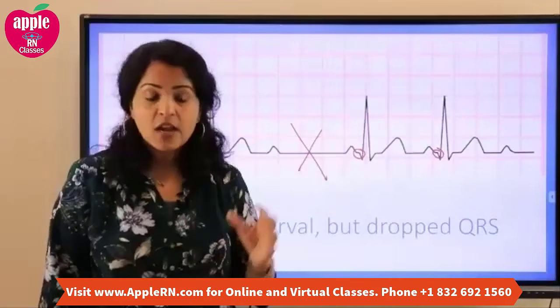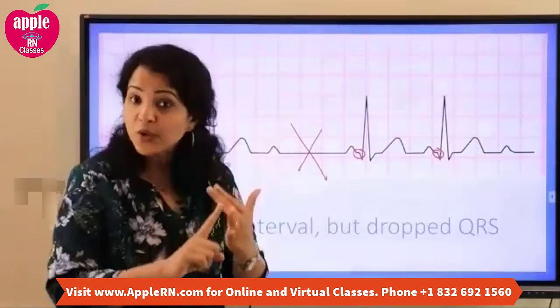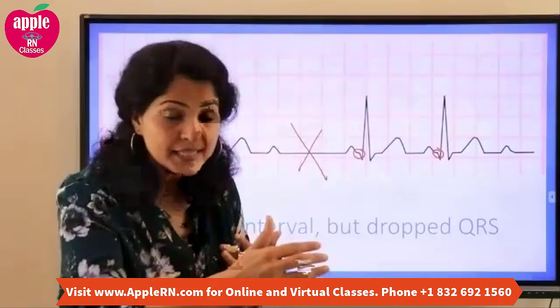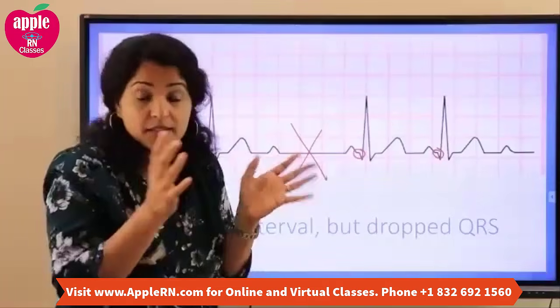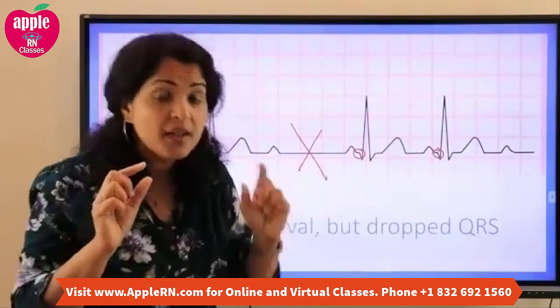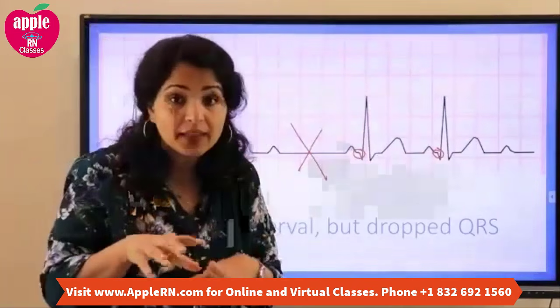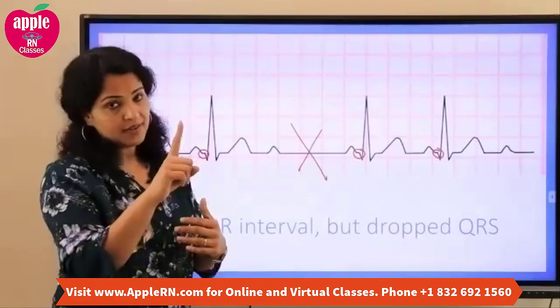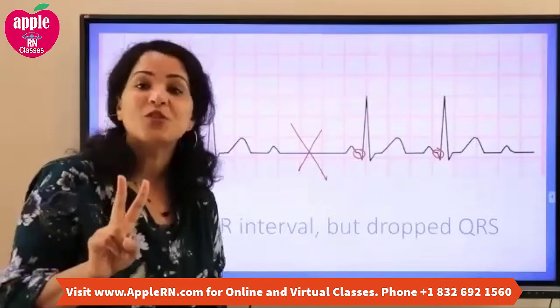How do we identify? Always look at the ECG and see if there is a P and QRS for each beat. If there is a P and QRS for each beat, then that is good. Then look at the PR interval. If there is a P and QRS, but the PR interval is longer, that is first degree. Now, if there is QRS dropping, then it's second degree. In second degree, if the PR interval is getting longer and longer and longer before it drops, then it's type 1. If there is no change in the PR interval, but suddenly it drops, then it's going to be type 2. Okay?